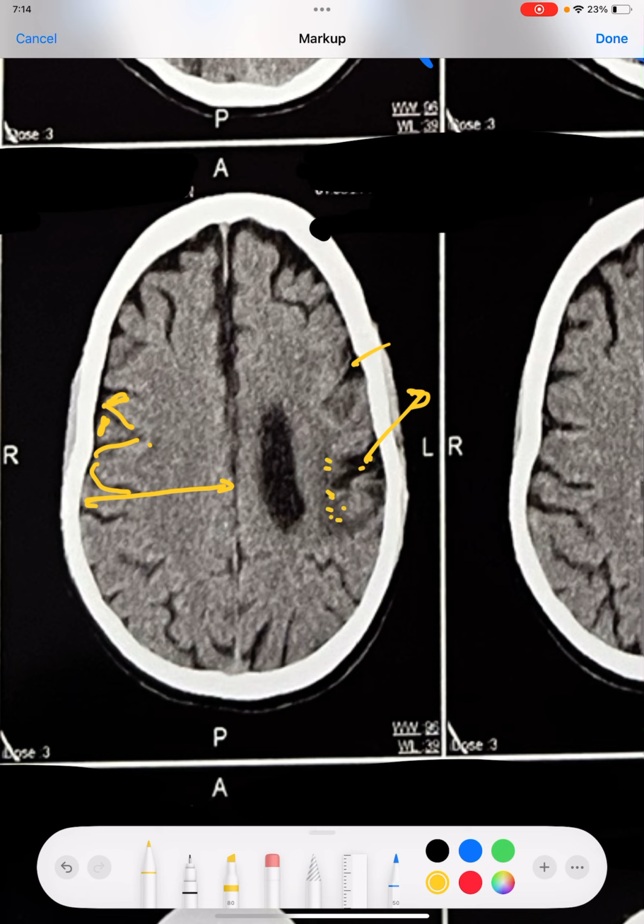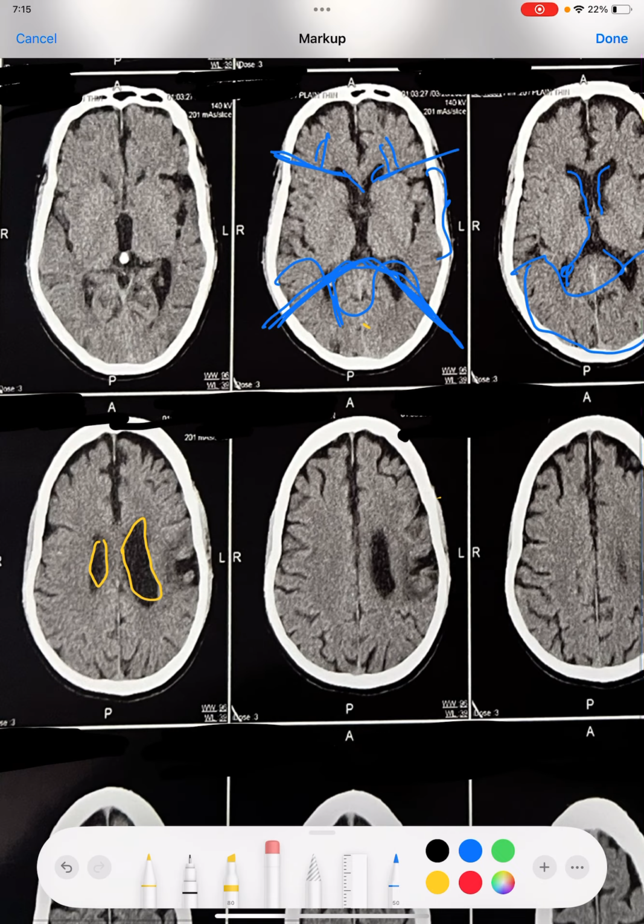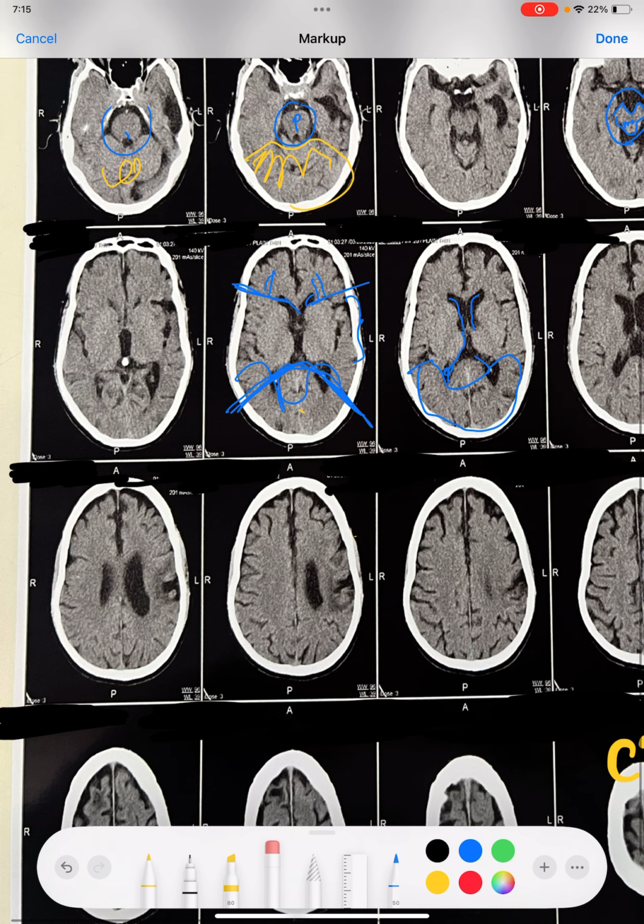Here also there is radiolucency, meaning ideally there should have been brain, but the brain is not there, meaning the brain is damaged here. If we trace it here as well, we can very clearly see that the brain parenchyma is significantly lesser in this area. There is radiolucency, so the ventricle automatically expands on the left side. In short, this is basically an old insult.